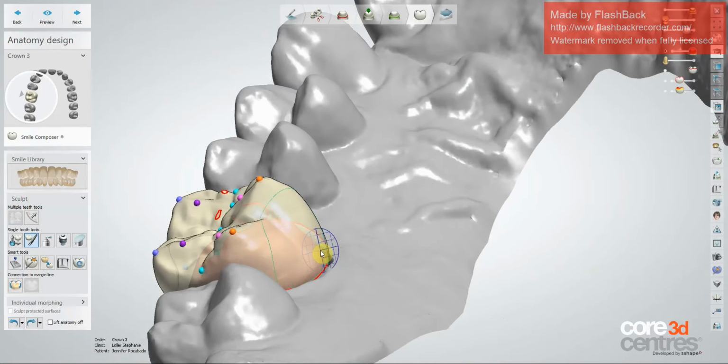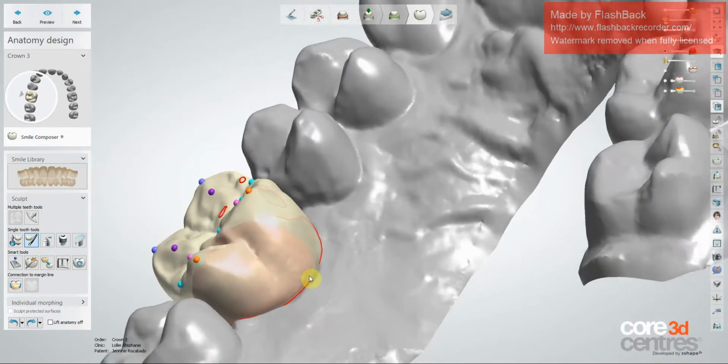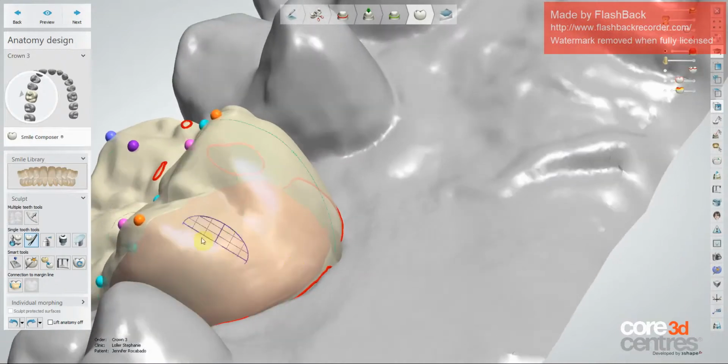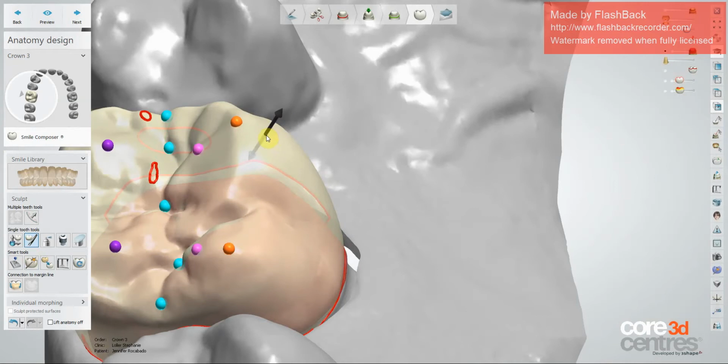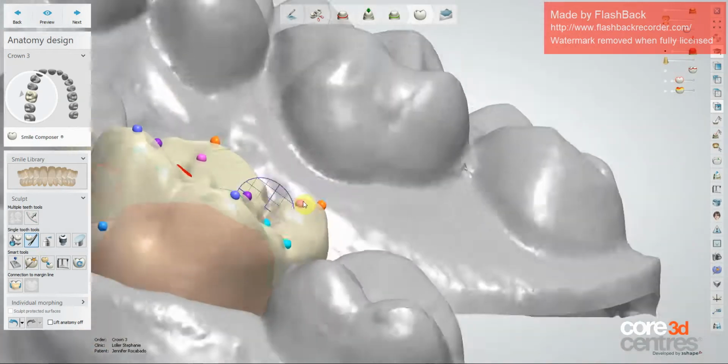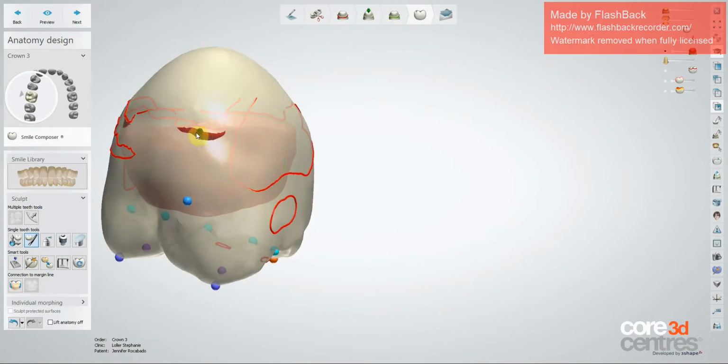Okay, most everything you can do in 3Shape you can do by touching a keyboard, touching the button on the keys, or touching a key, versus coming over here or coming over here. Most everything. Okay, I don't like this, it's a little bulky, so what I'm going to do is bring it back. Big circle of influence. Bring this down. Little things, I'm tweaking little things, but I'm using a big circle of influence, little movements.